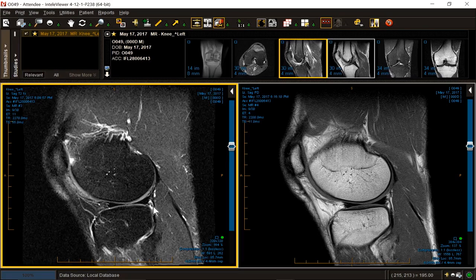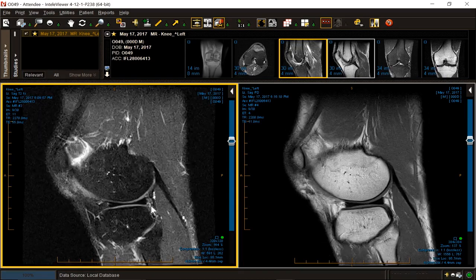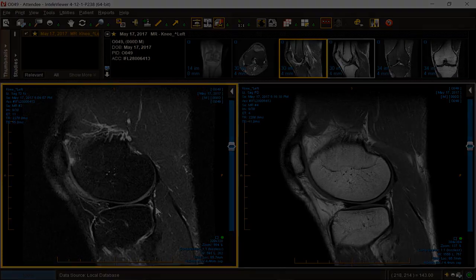The inferior popliteal meniscal fascicle, which wouldn't bother an old goat like me, who doesn't rotate at 180 radians per second and can't run worth a hoot. It wouldn't bother me at all. But for somebody like this, problem. That is a menisco-popliteal fascicle disruption.